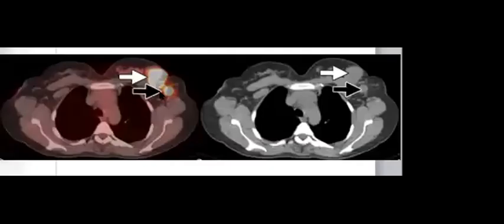You need to check the raw image or the axial image. When you select the axial image in the breast, you can easily find that there is a left breast mass and there is lymph node metastasis.